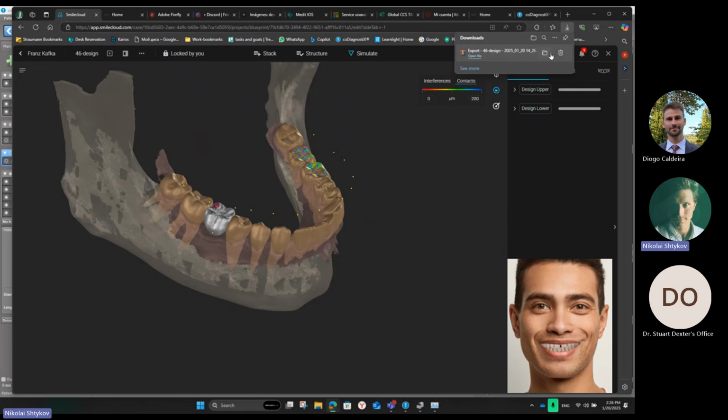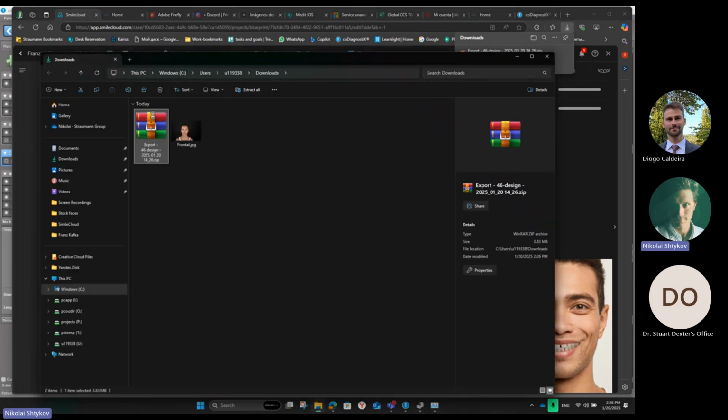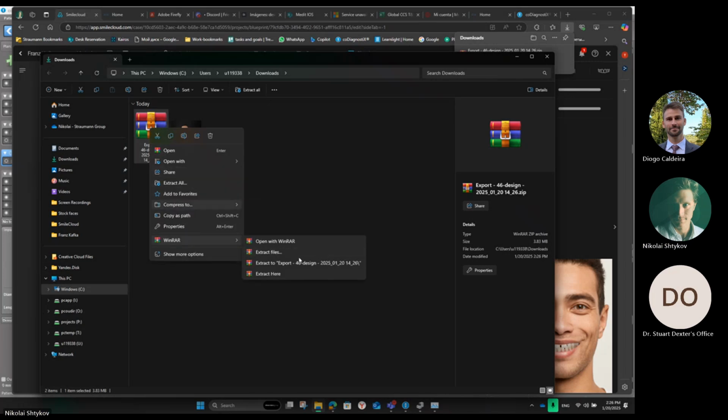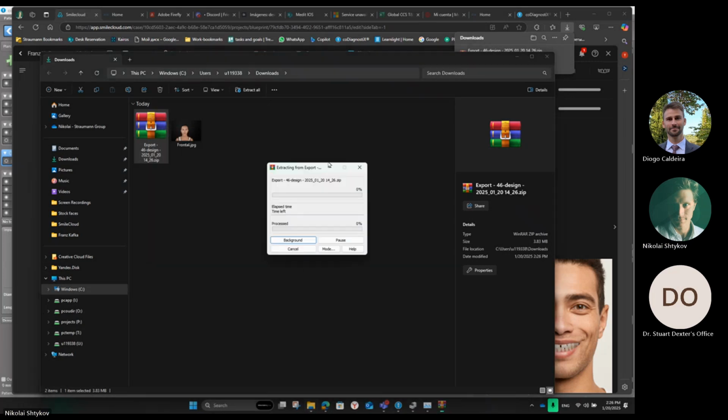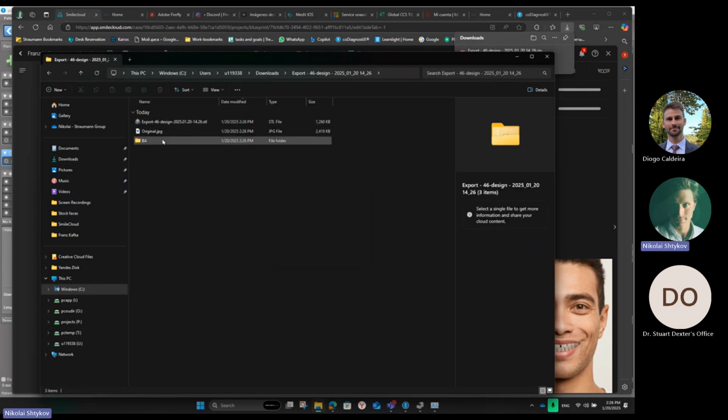And then I will open this folder. You can see that this is an archive. Yes, and now I can have this export.